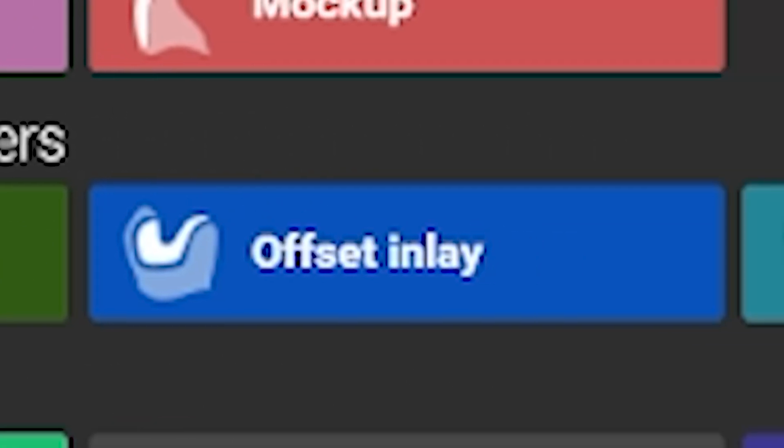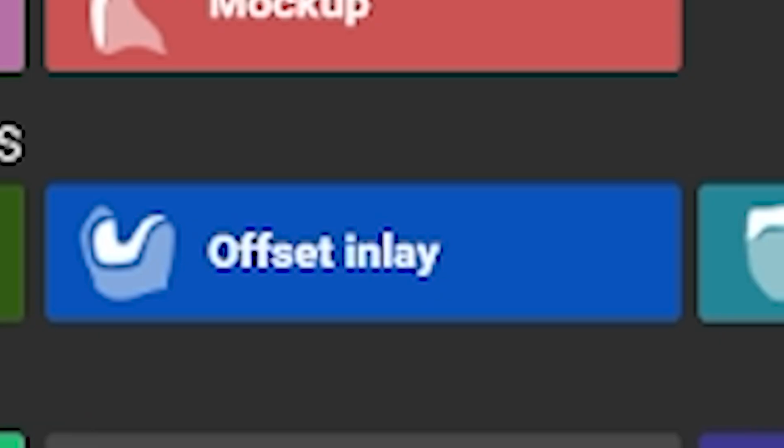Offset inlay. We choose offset inlay when we need a small internal gap between the restoration and the prepared surface, for example, for cement space. This affects the workflow by adding a uniform offset inside the inlay geometry. The tip is to keep this offset small, usually around 50 to 100 microns, depending on the milling machine.